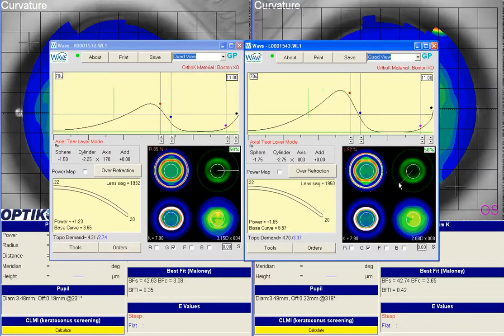So we should have a similar appearance here, where in the oblique meridian, everything is kind of in between our horizontal and vertical. Our differential is about a diopter, and that will hopefully mold out the remaining cylinder that's in the left eye. So that's how I would go about creating an oval optic zone specifically for the purpose of molding out corneal cylinder. Hope this helps your patient.